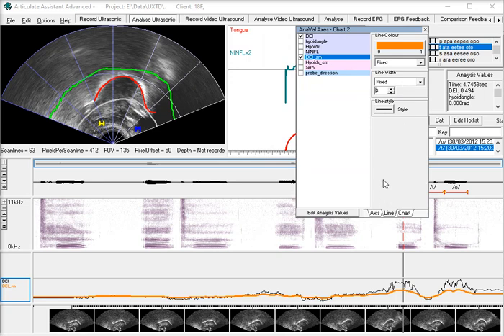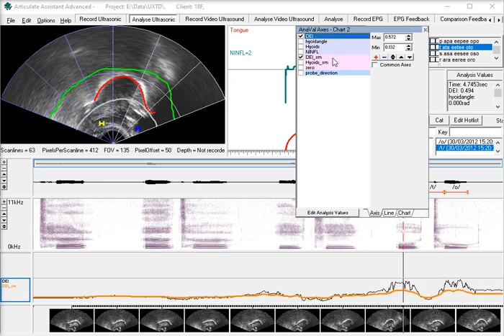There we go. And if we change this to the axis value, and we want both of these to have a common axis, and then to find the maximum and minimum extents to plot it. And you can see now that there is a smoother version of the dorsum excursion index. This is probably a more reasonable estimate of this dorsum excursion index value.